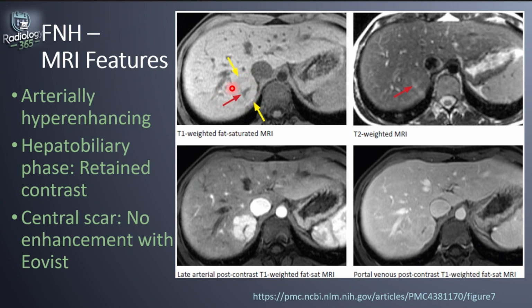What we actually can see is this low intensity scar pointed to by this red arrow here.